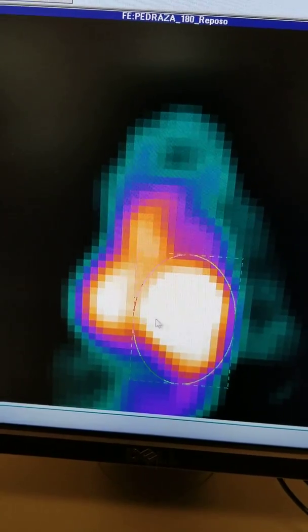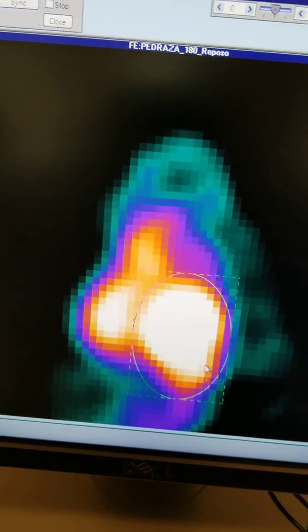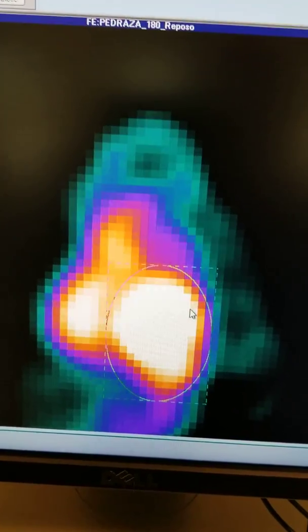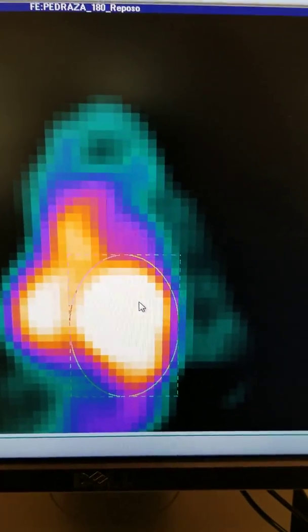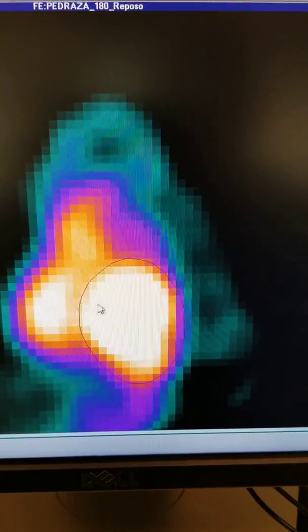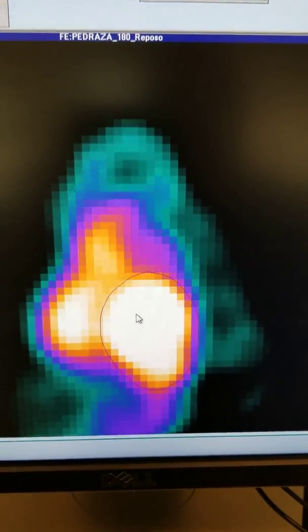So now I'm gonna play with this. Okay, so I have adjusted the gradient here, the circle, and what I found easiest was to make the gradient just entirely too large. All right, it made it easier for me to adjust during the hand editing. Okay, so that's what I left it at. So once I'm happy with this, I'm going to right click again. It finalizes the line there, right? Awesome. We're not satisfied with this. We don't want to leave it at that.